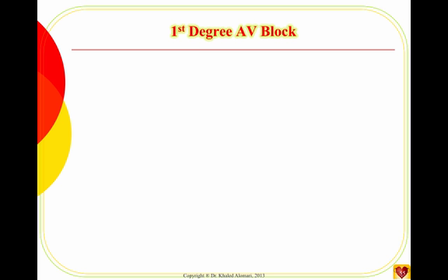So the major thing that distinguishes the AV block's rhythm is the long PR interval. The major thing that distinguishes the junctional rhythms is the inverted P wave. As you see, each rhythm has its own one or two things that are only found in this rhythm, and that will make life easy for you. You will be able to identify the rhythm just by looking at some of these features. Okay, so again, we agreed now AV blocks means it's a PR problem. The PR interval is long.